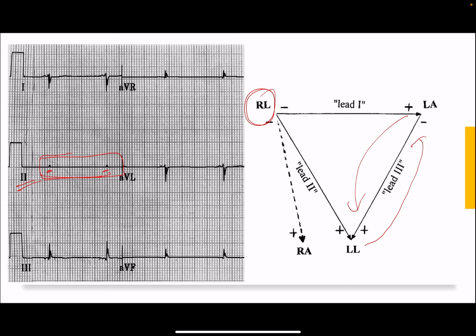Whenever you find one complex with an almost flat isoelectric line or very small complexes, always identify this.